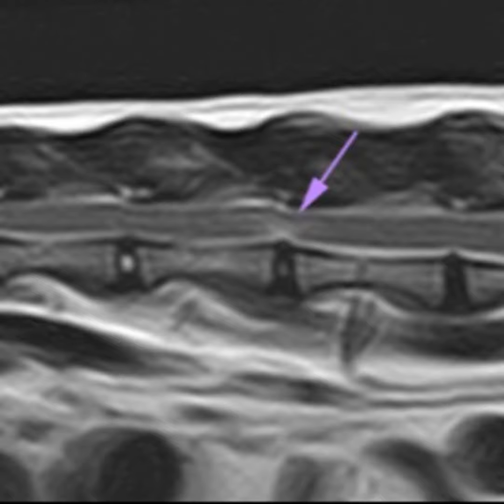This different proportion could be linked to the design of our study itself, which for the first time evaluates the distribution of all types of intervertebral disc extrusion at the same time in a feline population. Moreover, a relationship between the type of intervertebral disc herniation and clinical presentation was confirmed by our study, which was in agreement with the study by De Decker.